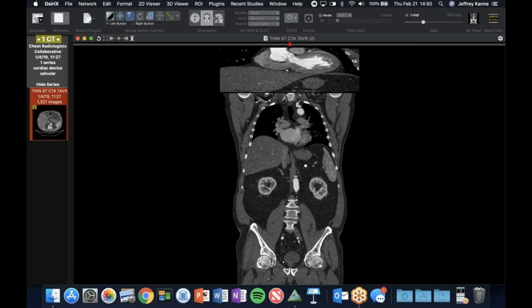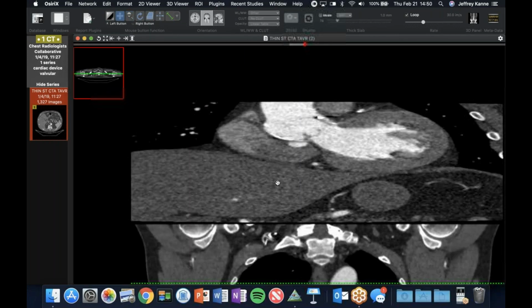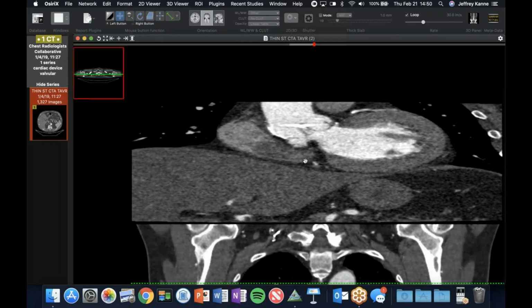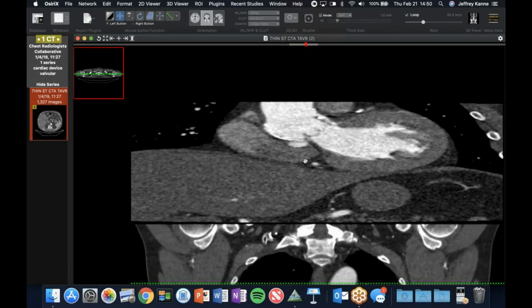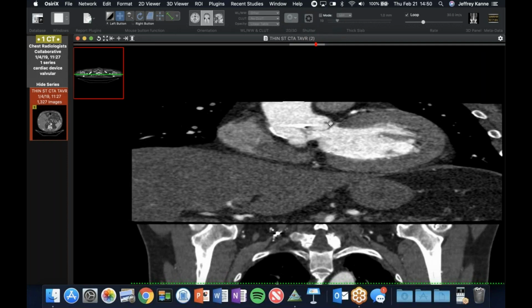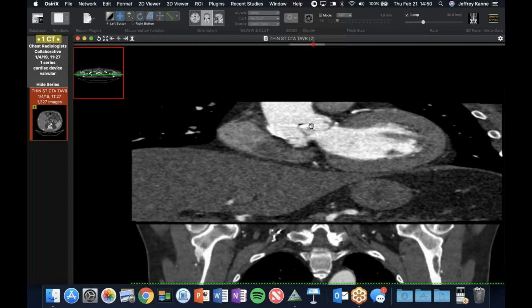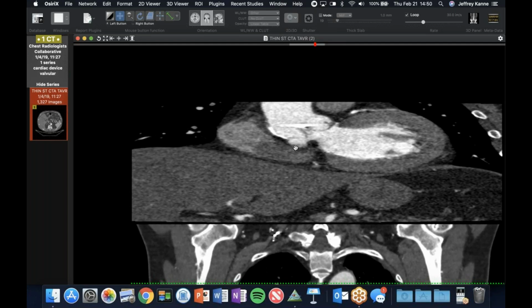I'm sorry with the overlap there. Let's see if I can bring it out here. This valve has a perivalvular leak, and the valve itself is sort of dehisced. It's almost not quite floating, but it's not in its normal place. There are the native leaflets, what's left of them. So this went from a TAVR case to a surgical case, but so very tricky.